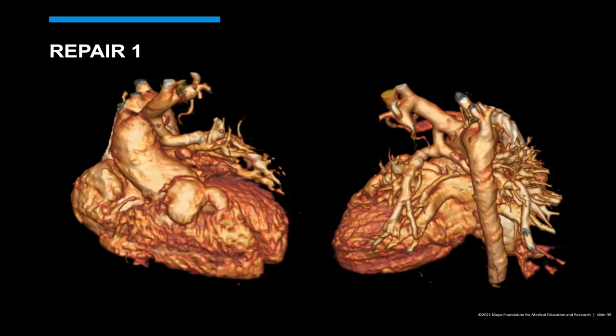So this is a Blalock-Taussig shunt. In this case, they have some synthetic graft that connects the subclavian artery to the pulmonary artery. This is an infant that was born with a cyanotic congenital heart defect, I think tricuspid atresia, if I'm not mistaken. And so very early in life, they need to get blood somehow to the pulmonary circulation.